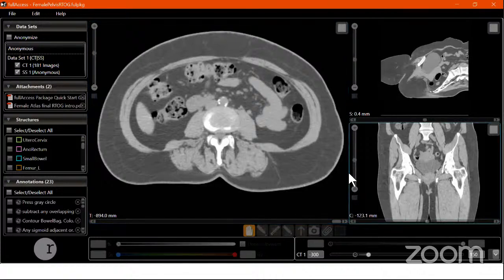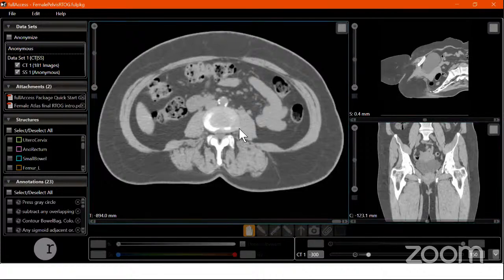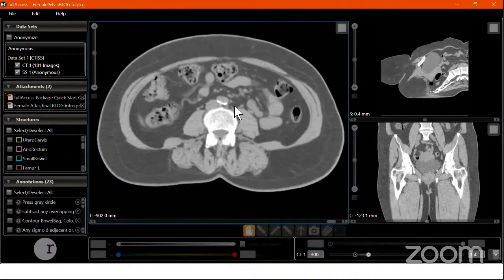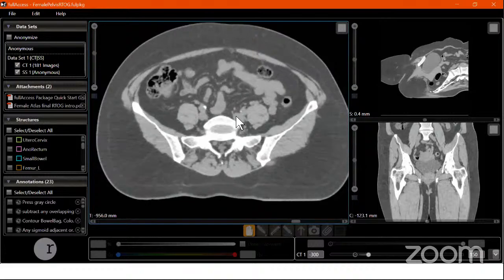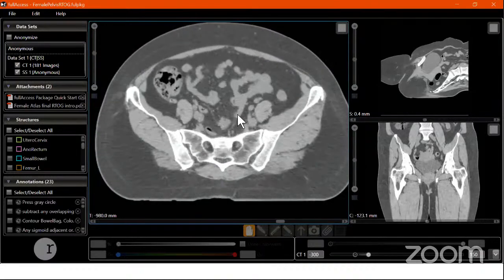This image doesn't show the para-aortic nodal group, but I've just told you the guidelines and the reasons where we include para-aortic nodes. Fine. So now coming on to the primary site. The primary site involves basically the cervix.